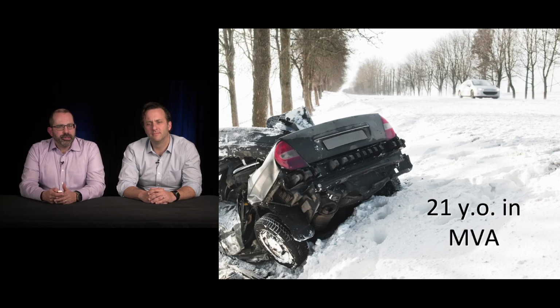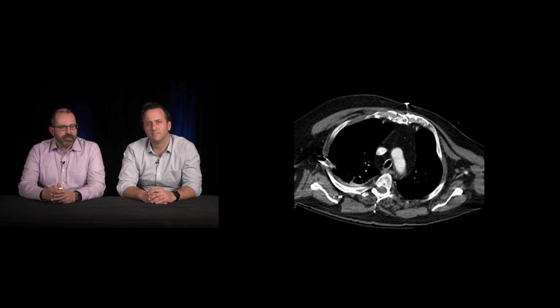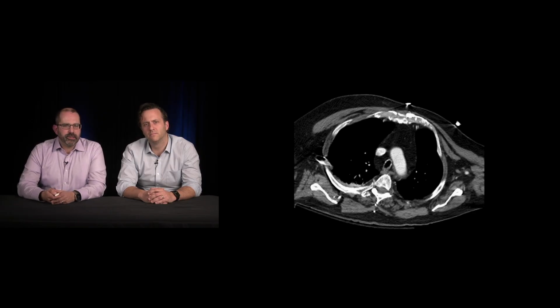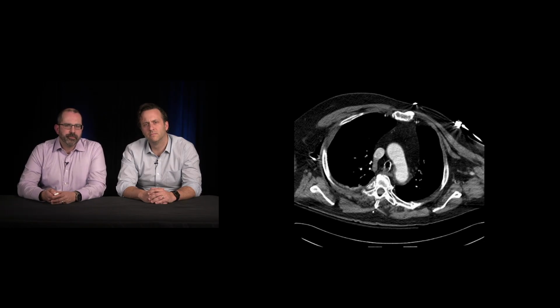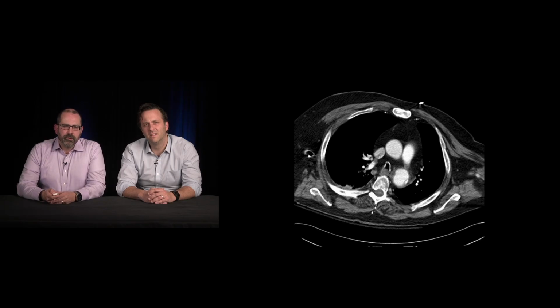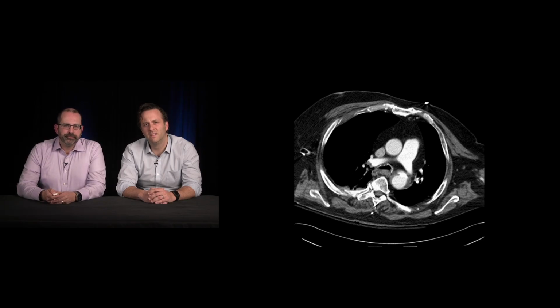All right, switching gears a little bit, moving into some trauma cases. This person comes in, high-speed MVA. Obviously some obvious external trauma. We're worried about this patient, so we get a CT. As we're starting to go through, let me know when you start to see anything. Yeah, something right there. A little bit more further down.